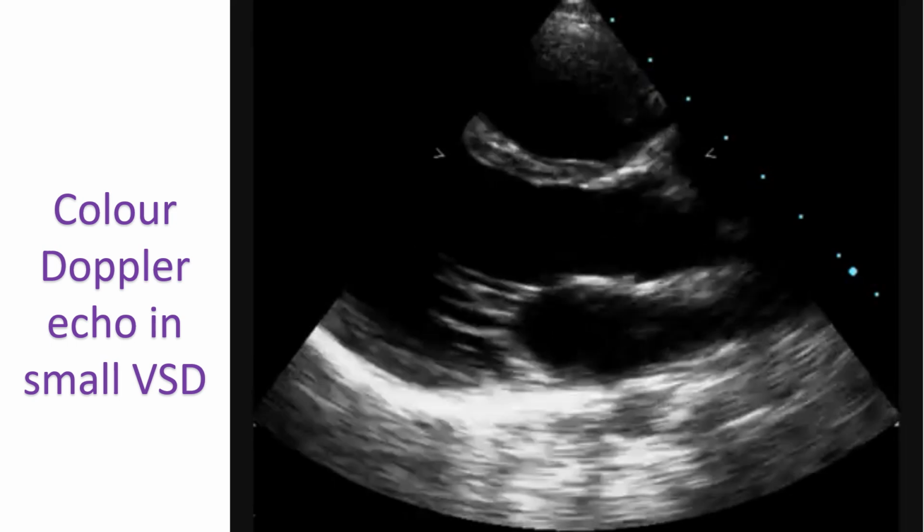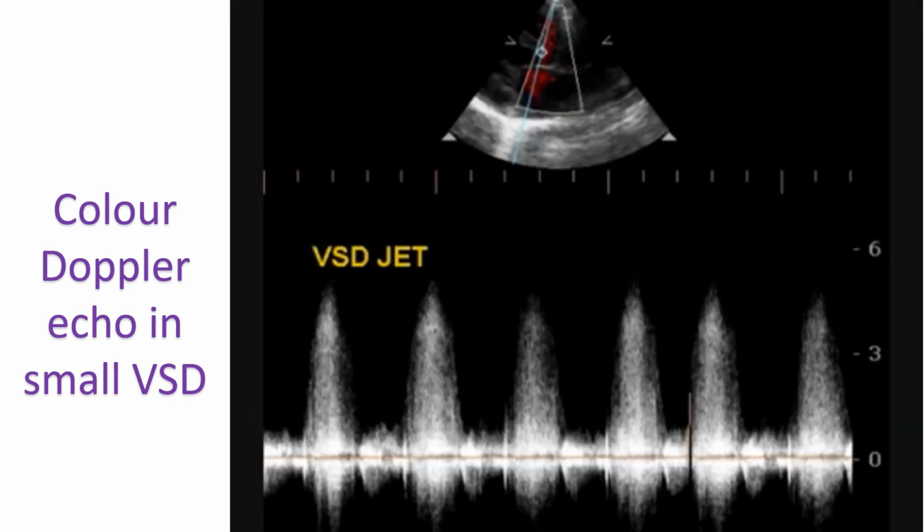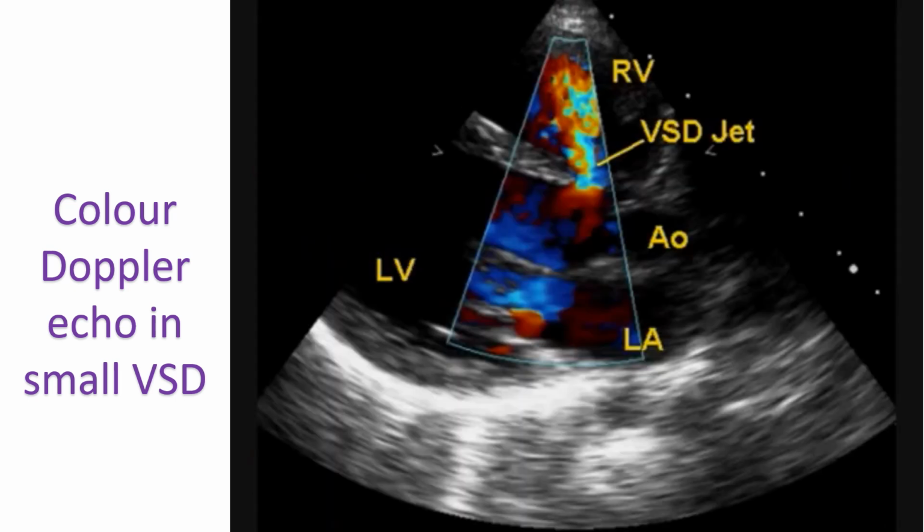Color Doppler echocardiography is very useful in giving a quick visual assessment of regurgitation and stenosis of heart valves. It will also show abnormal flows as in an atrial or ventricular septal defect. Mosaic colored jet on color Doppler echo is easily seen.